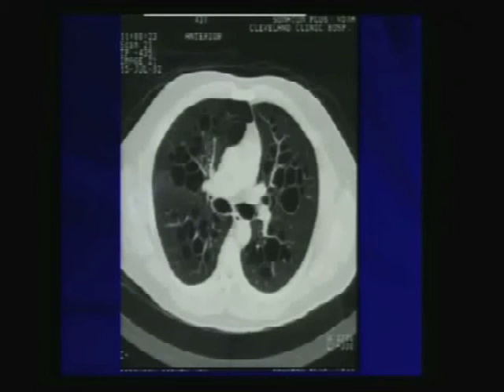How about this one? So now we see a lot of cystic disease here. Now this one has a wall. The rest of the lung parenchyma looks fine, but look at the distribution of those cystic changes. They're more to the center of the lung. Well, I showed you a patient with paraseptal pulmonary emphysema. Now this one is the opposite. It's more medial. Anybody?